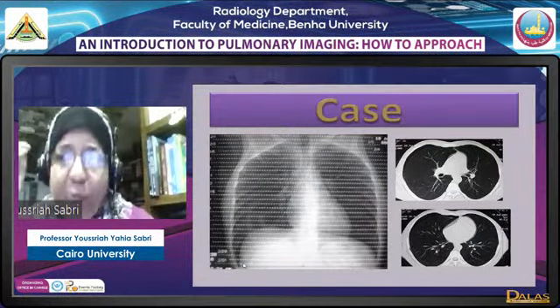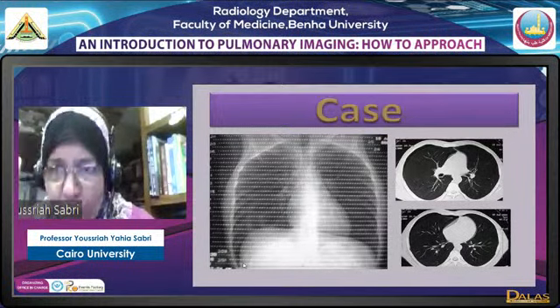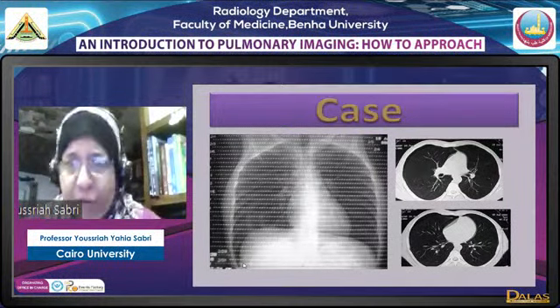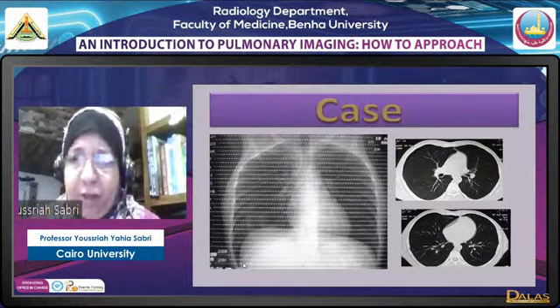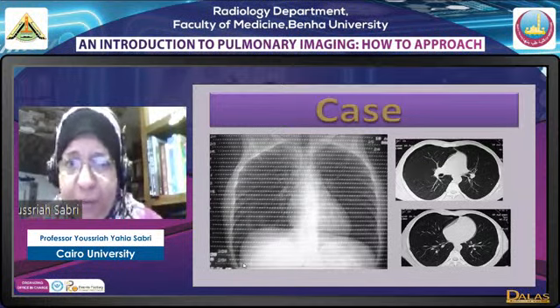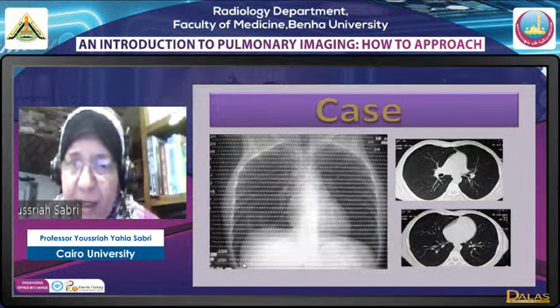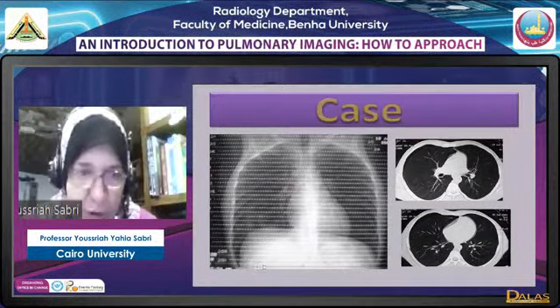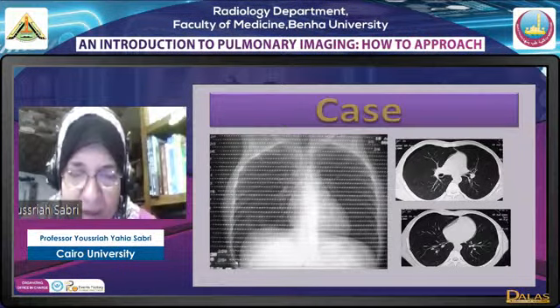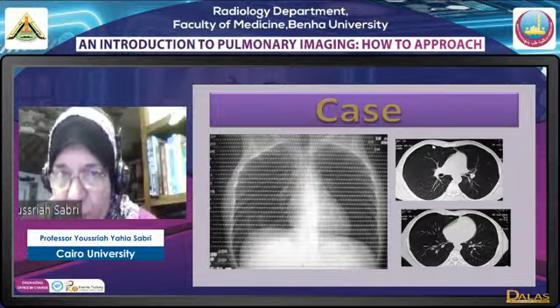It's extremely important to know how to diagnose pneumothorax, hydropneumothorax, and effusion in a supine patient, because this will happen in a case of trauma, post-operative, or a patient in the ICU. All of these patients cannot stand. And if you don't diagnose such entities in those patients, you will miss and you will cause marked harm to the patient. This is a deep sulcus sign where we have a very deep going down costophrenic angle. And this is how we see the pneumothorax in this patient.